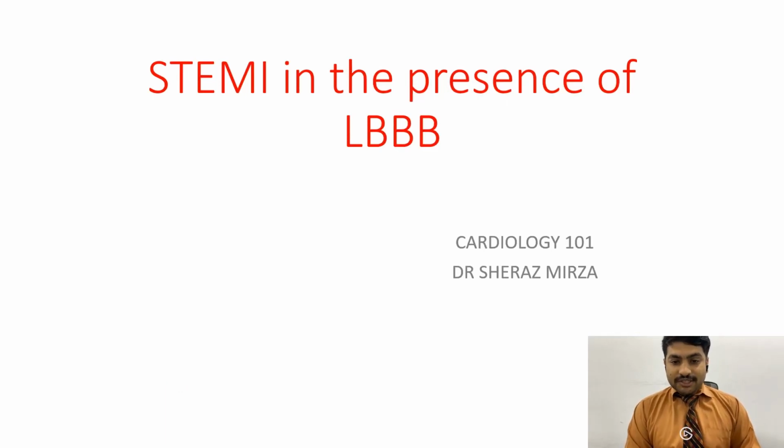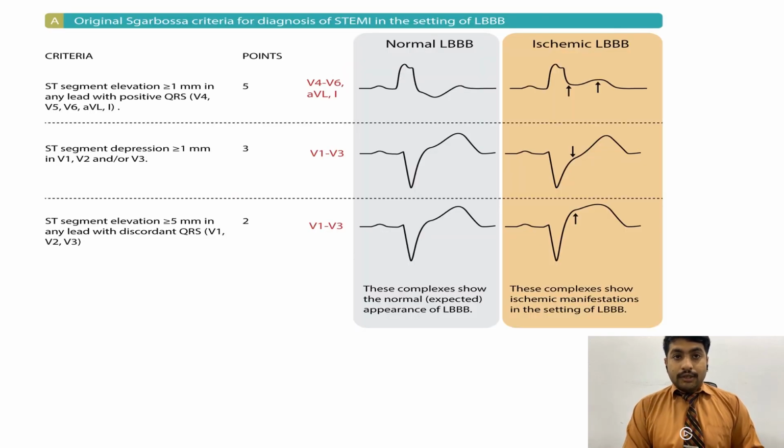This is Dr. Shiraz, and today we are going to talk about a very important concept, that is how to identify STEMI in the presence of left bundle branch block. So the criteria through which we identify STEMI in the presence of LBBB is Sgarbossa criteria.